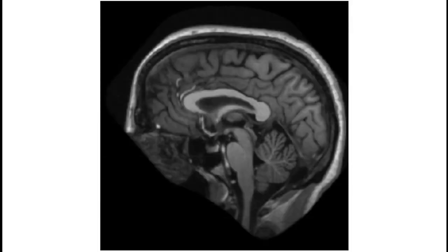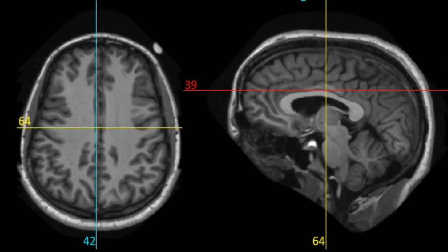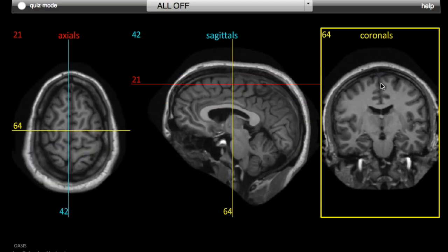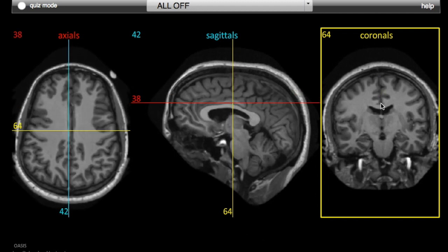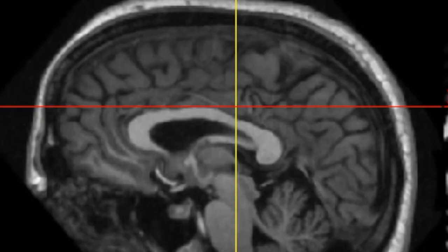Using those two as landmarks, we're going to start with those slices above the level of the body of corpus callosum. And remember, we're focusing on the axial slices, keeping our eyes on the midline, then moving laterally. So starting from the top, as you start to see more tissue, you see the longitudinal fissure, which divides the two hemispheres of the brain. But in terms of structures, all that's at this level are the cerebrum and skull. You see no midline structures. The corpus callosum and lateral ventricles aren't visible at this level, only cerebrum, namely the frontal and parietal lobes. We're too high up to see the occipital or temporal lobes.